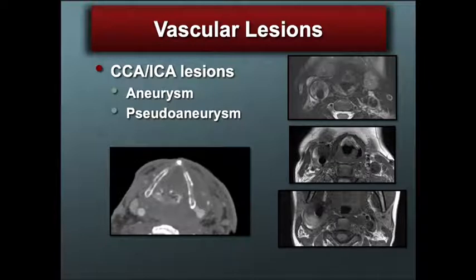The one on the left is a patient who had been treated for head and neck carcinoma with radiation treatment and came into the ED with abundant bleed, and you can see the pseudoaneurysm in this on the left side, unfortunately.